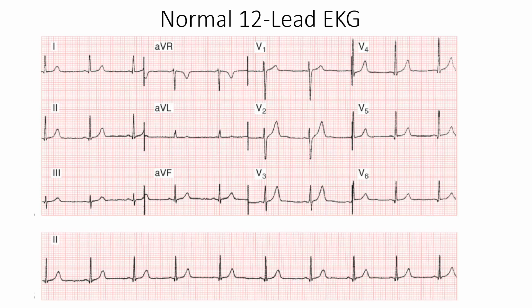I think it's a good idea when you're sitting down for each session to study EKGs that you spend a few minutes just looking at a normal EKG. And don't just stare at it randomly. Just excursively go through and say, what are the inferior leads, 2, 3, and AVF? How should they look based on the leads that represent them? How should 1 and AVL look, V1 and V2? And what are the differences between V1 and V6 in terms of how they represent the heart's electrical activity? And look at AVR. It's so weird.